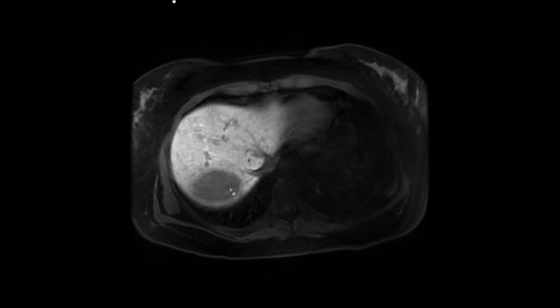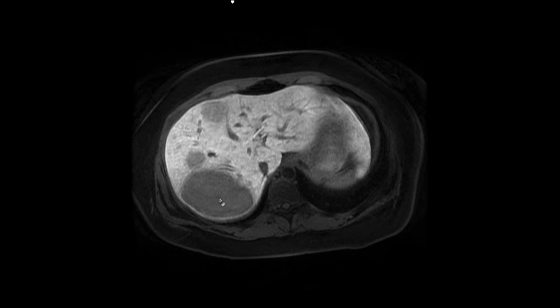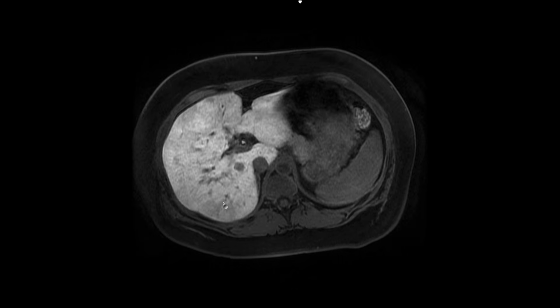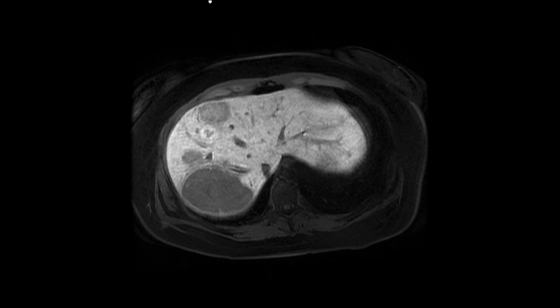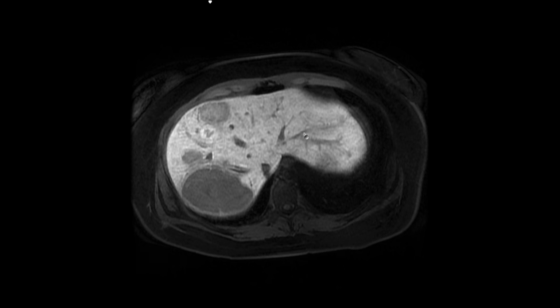And all these other ones don't, especially this one posteriorly here that was quite T2 hyperintense, was heterogeneously enhancing on the arterial phase, and takes up no EOVIST. So this is a young female patient, and again, the purpose of this is not to show you how to characterize liver lesions. We'll talk about that later, but the purpose is to know what a normal MRI looks like and then show you how things stand out nicely compared to background on these various sequences.